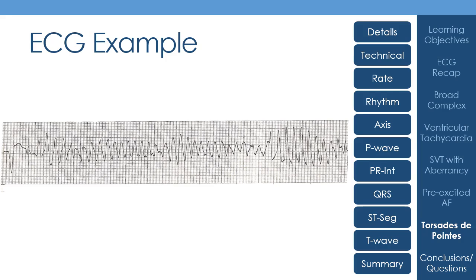The other is, if you look at the very far left-hand side, you see a ventricular beat that looks very different. And this is probably a normal ventricular beat for the patient. And then they have this T wave, and just as the T wave is ending, you've got this other little depolarization that occurs. And this is what's called an R on T phenomenon. So you've got an R wave, this ventricular depolarization, occurring on a T wave.